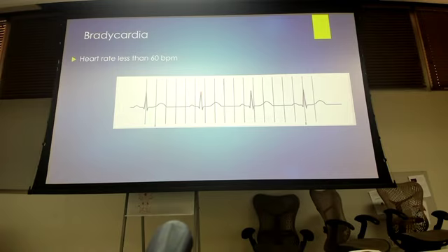Okay? And so we know, though, if we look at the bottom, we've got 1 here, and we've got 1 here. So if you had this on an exam, could you use this and say this is a 6-second strip? You can't, because we only have 2 lines. We must have 3 lines in between. So this is a 3-second strip. From here to here is 3 seconds. We're missing the other half.